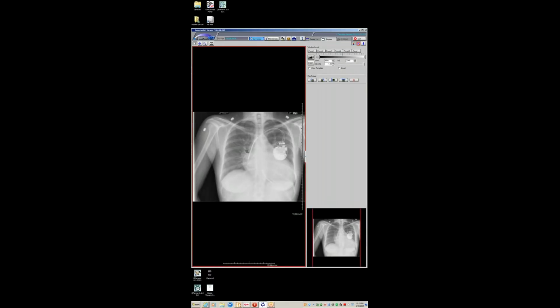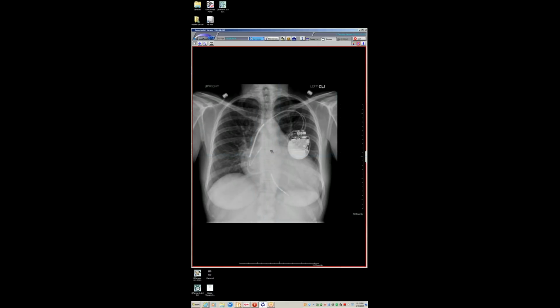And this was the case that I showed some of you guys. I figured I shared it with you guys for Jeff's poster, I might as well include it. So here's a patient who is a meth user.